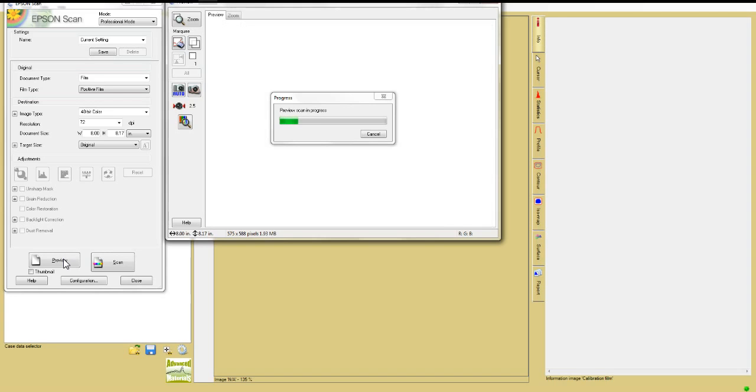Thumbnail images now appear in the case object. The top one is the image itself, and the bottom one is the mosaic image, which at this stage is no different since there's only one component.